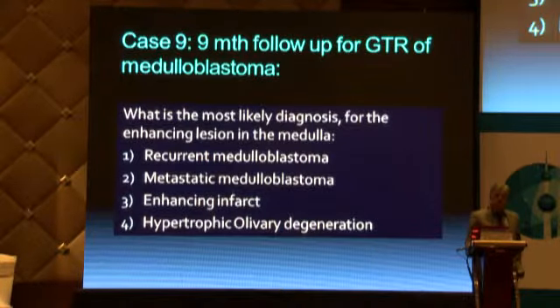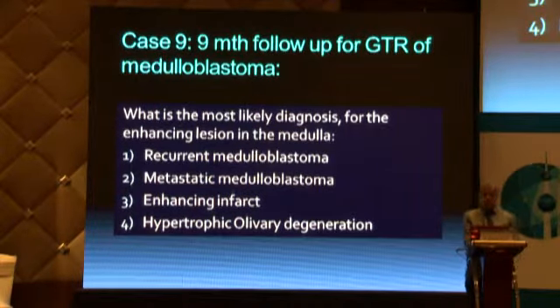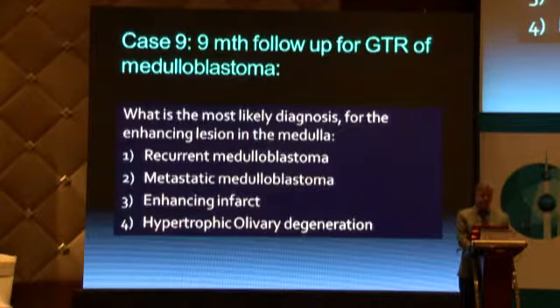Now having seen that medulloblastoma, having seen the post-surgical changes and having seen this clinical history and these images, what do you think is the most likely diagnosis? Is this recurrent medulloblastoma? Is it metastatic medulloblastoma? Is it an enhancing infarct? Or is it hypertrophic Olivary degeneration?